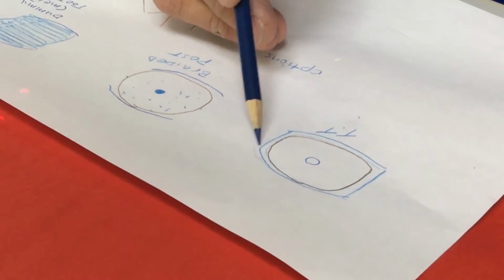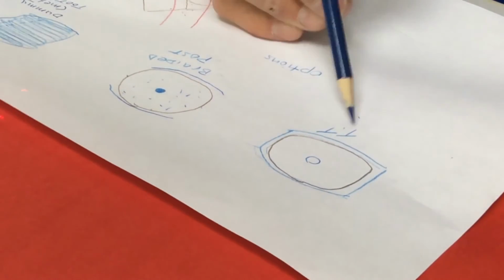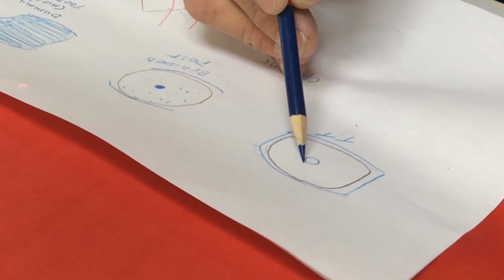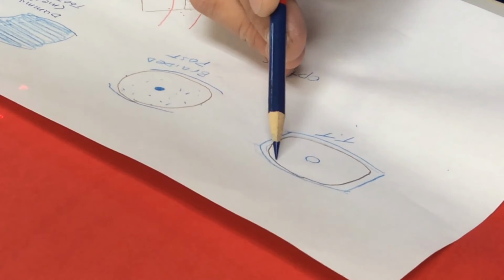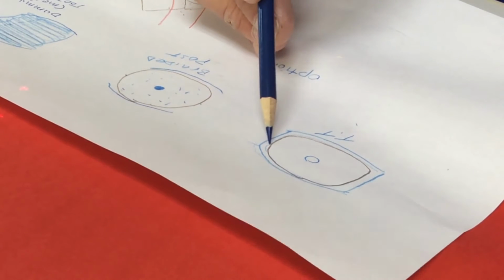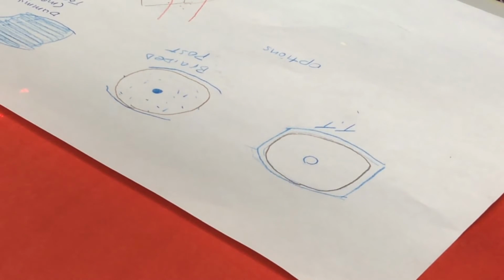Okay, this is just showing in between where our guide plate's then going to come up off of here. We're going to mark it TT for tube tooth. We're going to put a hollow circle in the middle. That means tube tooth. And if we want to put some acrylic, we're going to keep the acrylic inside the blue. And that brown, which is indicating acrylic, is really indicating our tooth.